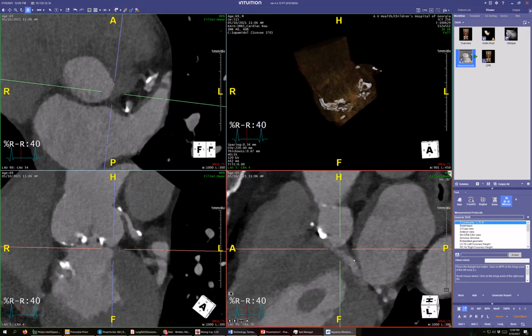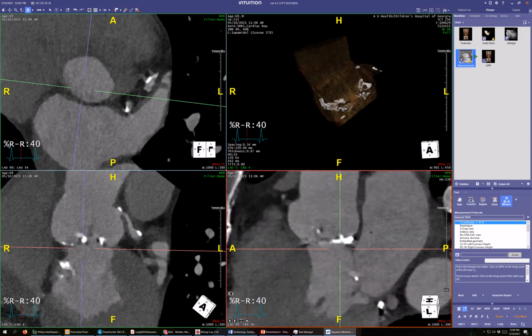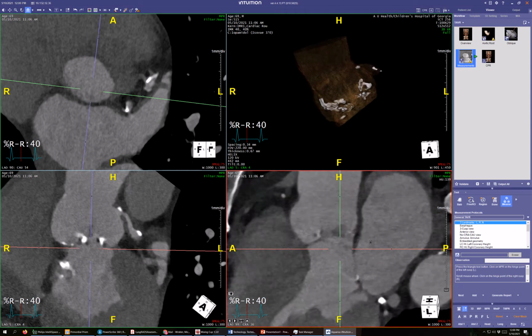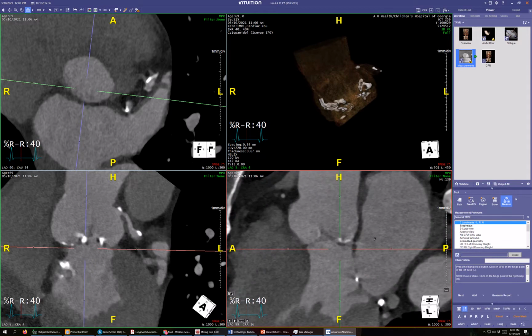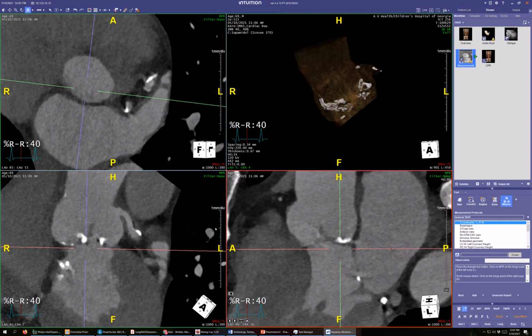That's 3 points, which are going to determine a plane. Now down here in the lower right screen, I'm holding down the middle mouse and the right mouse buttons together. The middle mouse button's the wheel, of course, and seeking that last hinge point by going back and forth, and I found it here. So I'm going to do a little bit of adjustment, and so now we've got our annulus.